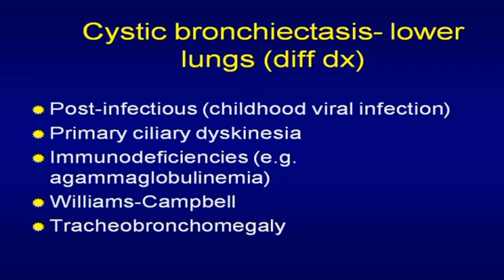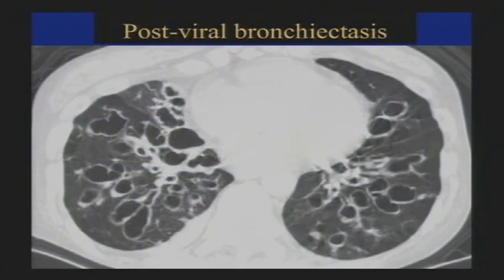And this was post-viral. This kid had an adenovirus when they were 2 years old, and this is the sequela of that 30 years later. And that's what happens.